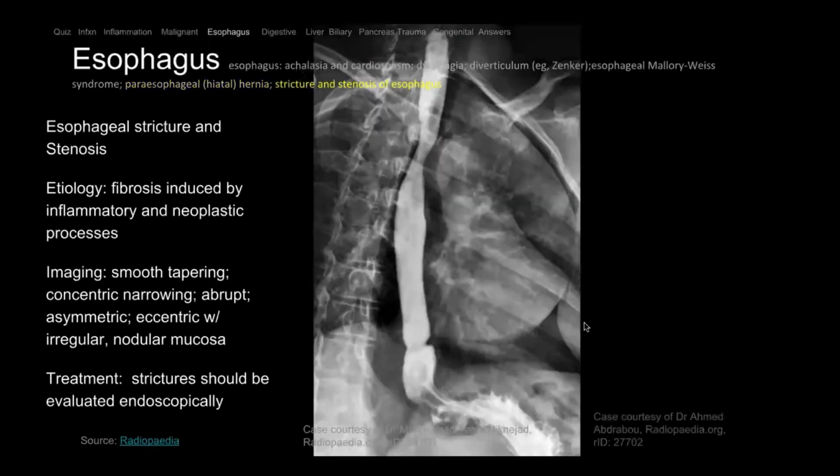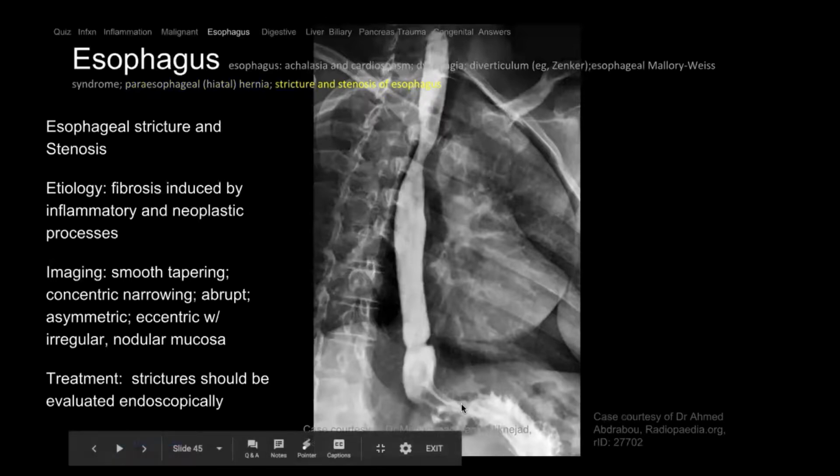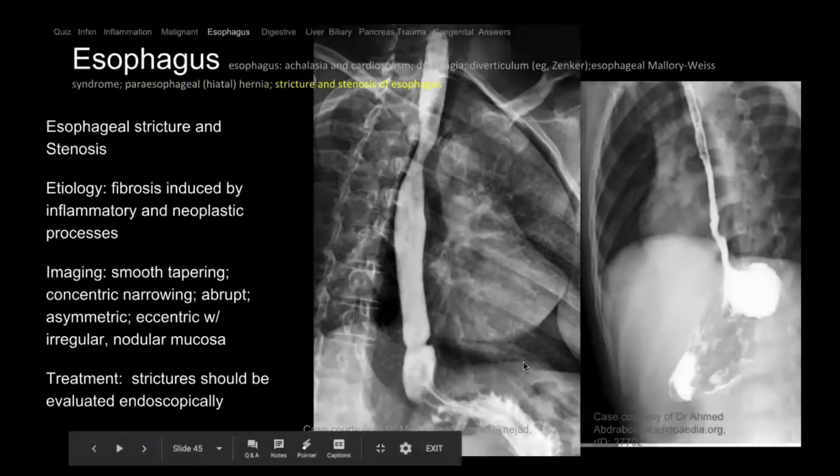And sometimes it can cause dysphagia, and patients have to get that surgically corrected. Here's another example of a nice stricture, a web, on esophagram. And so you see the distal esophagus, there's this waist that can cause dysphagia. So this commonly is from reflux stricture in the distal esophagus. And we said before, if it was like Barrett's, it could be here or even more proximal at the transition point between the metaplastic and normal epithelium.